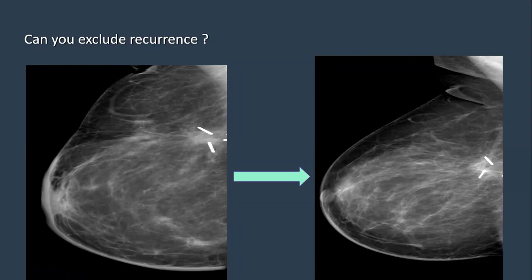And if the patient develops coarse calcification at the site, I have one case I will show you later. How are we going to analyze the follow-up case regarding the calcifications?